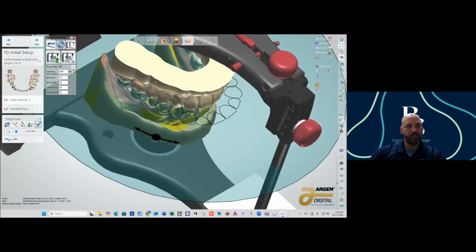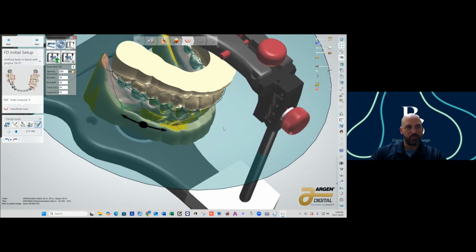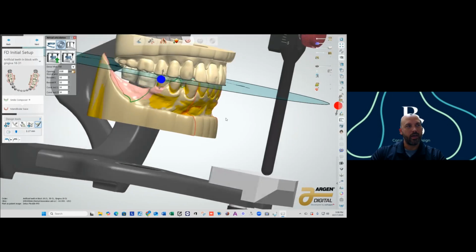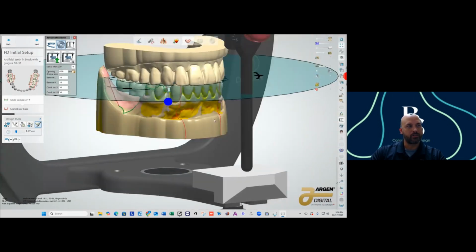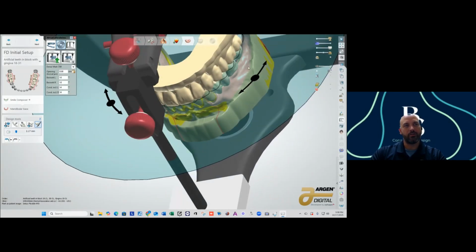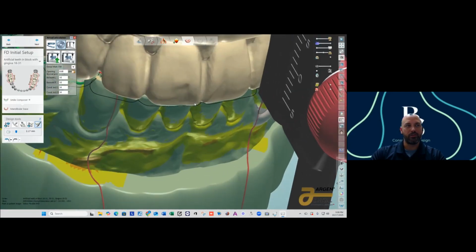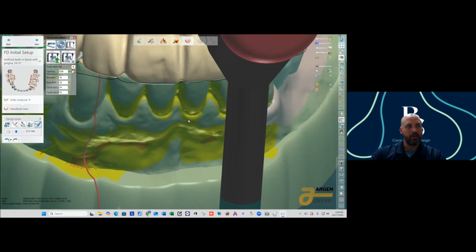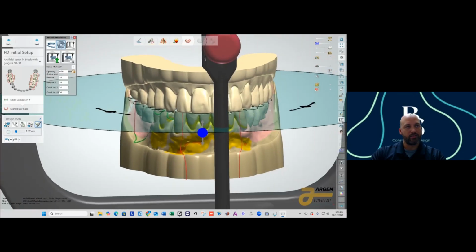We're going to position this so that, think of this as like we're mounting on a mounting table. So I'm going to position this right where the occlusal of those teeth are. This actually looks really good. The silhouette of teeth on here, these are all generic, so they don't match every arch. So you don't really need to focus on those, but I always make sure that my midline is right in the midline of that table. And then I also make sure that I'm kind of balanced out on both sides.